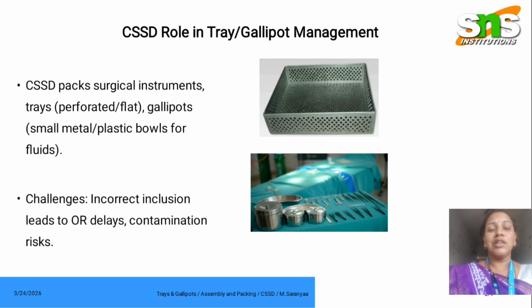As well as you have small metal and plastic bowls for placing of fluids. This method of using gallipots and the trays will help the equipment to be placed in a safe and secure manner, as well as it is helpful for the proper sterilization technique, as gaseous methods of sterilization like ETO can easily pass through these gallipots.